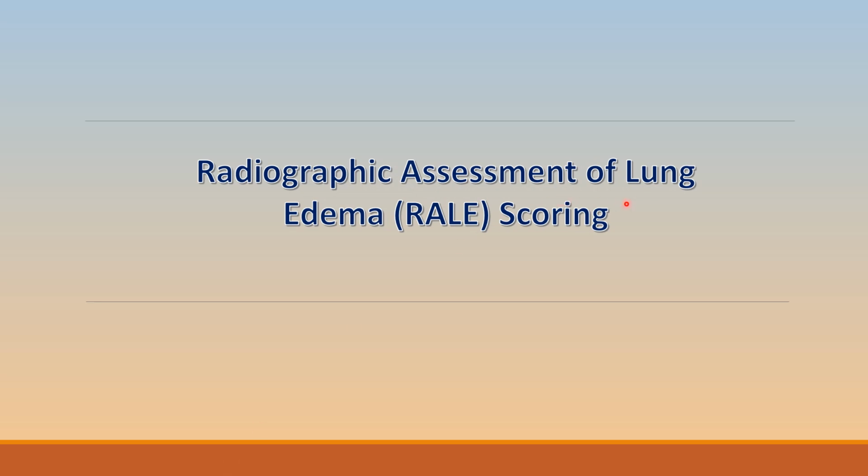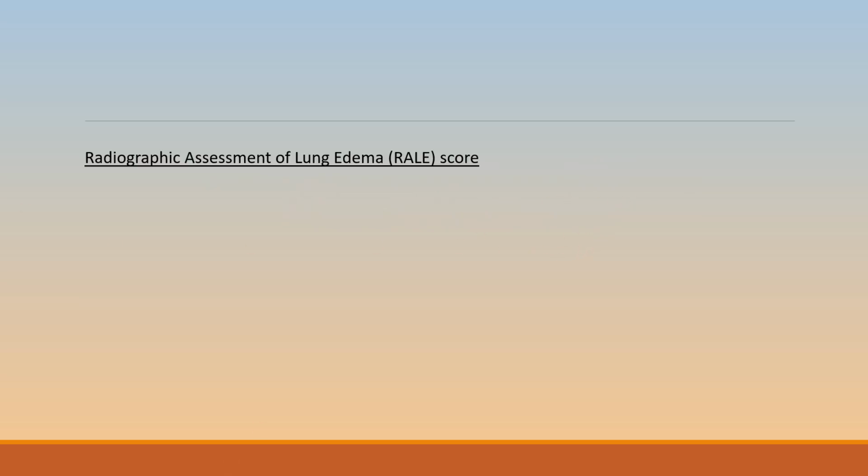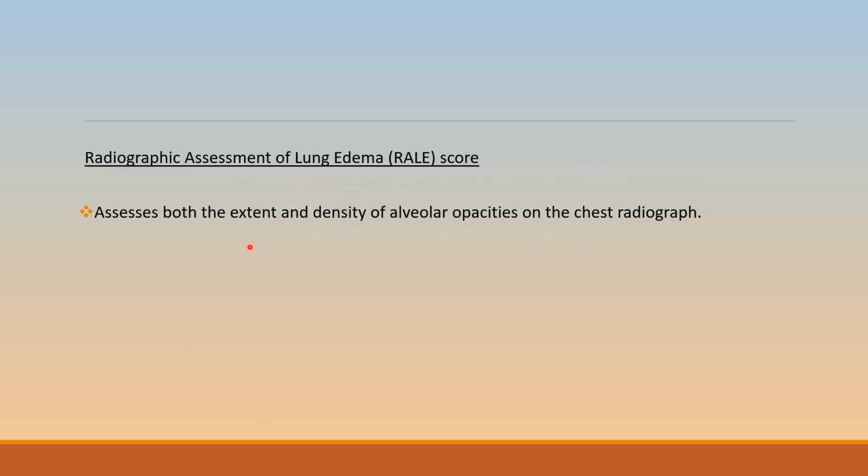So there comes the development of the RALE scoring, which is the radiographic assessment of lung edema scoring. It assesses both the extent and the density of alveolar opacities on chest X-ray.